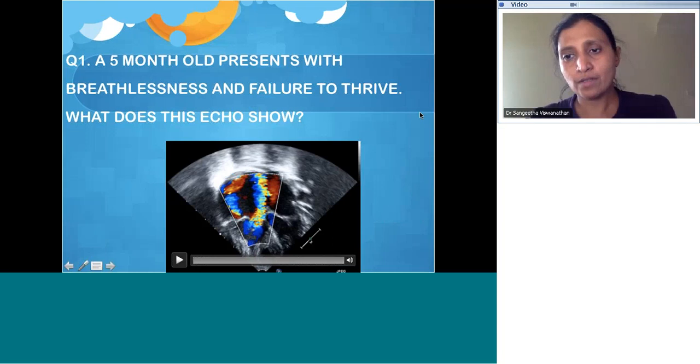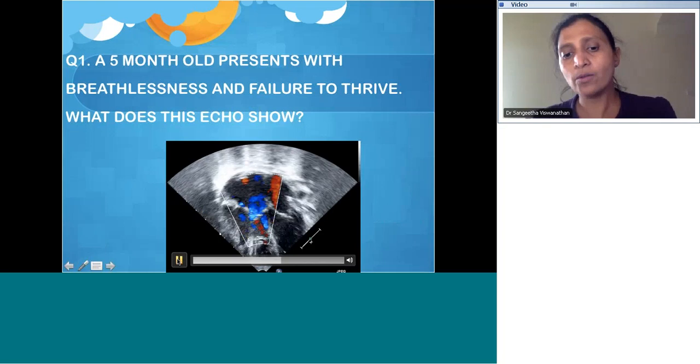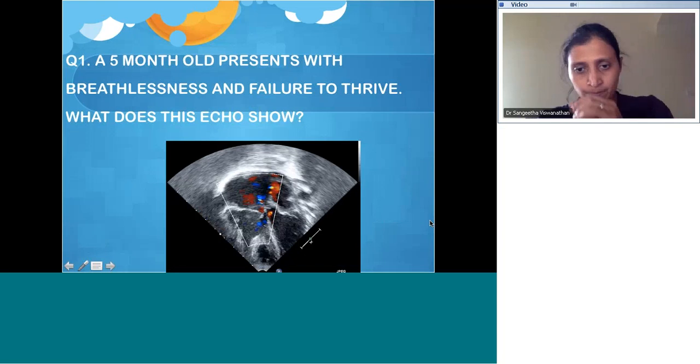First question. So it's a 5-month-old baby who presents with breathlessness and failure to thrive. Okay, and on echo, this is what you find. So what does this echo show?